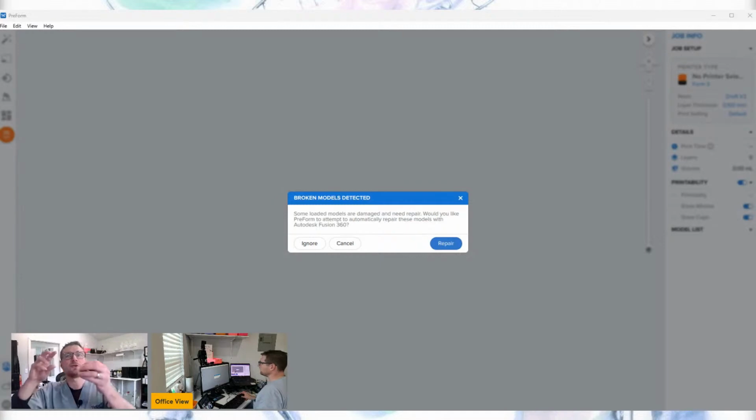Okay. So now those have taken that list that I have clicked on, said I want to print this one, this one, this one, this one, this one. And again, I do 6. I'll just print 6 at a time. That's just what I do. We can debate it. You can print vertically if you want. I'm scared to, but by the time it takes to print 12 vertically, I can print 6 and already be working on them while the next 6 prints.